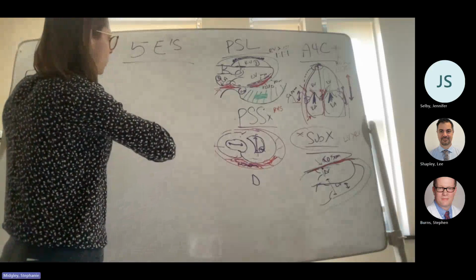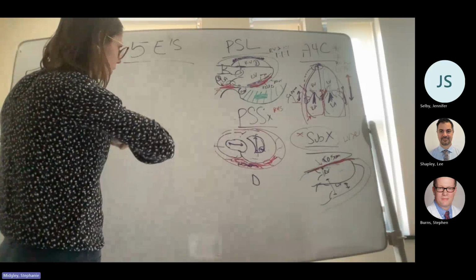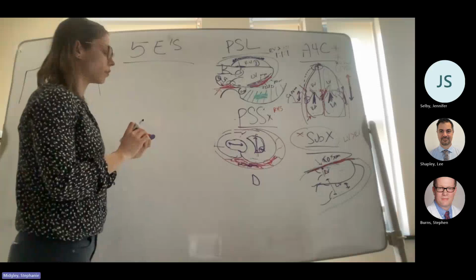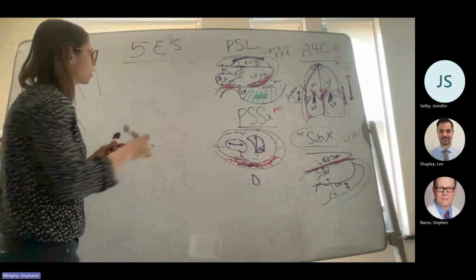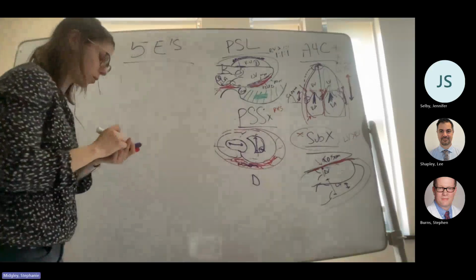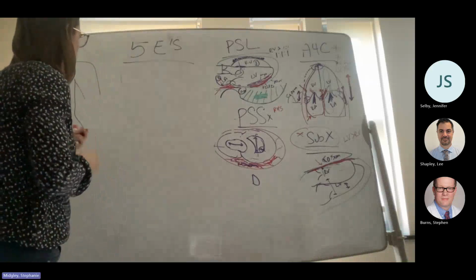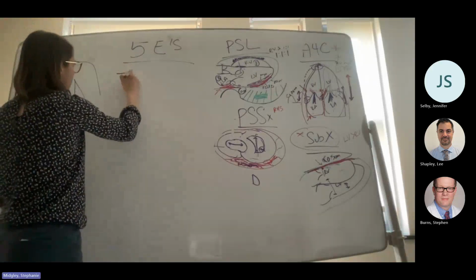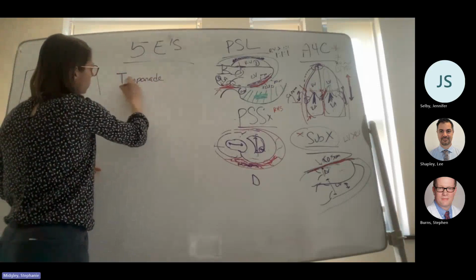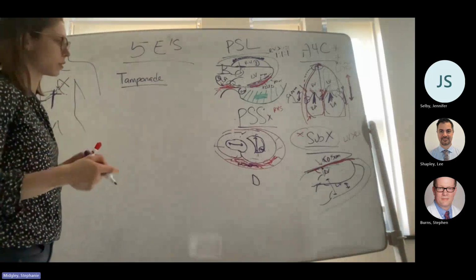Yep, doing okay. Okay, so we talked about how to see where the effusion is. The important thing I want to know is, is that effusion affecting the function? So tamponade, my brain is no longer working, should be an echocardiography diagnosis. I do not need to wait for my patient to be hypotensive or unstable to diagnose tamponade. Most patients in tamponade are actually hypertensive.